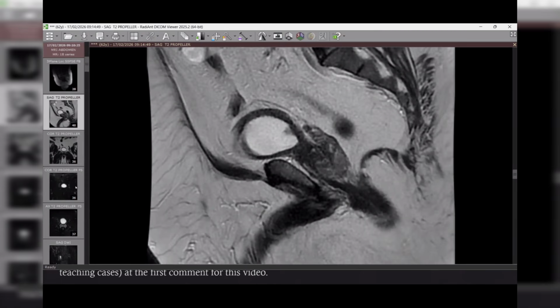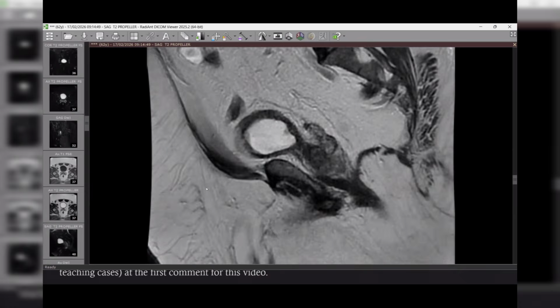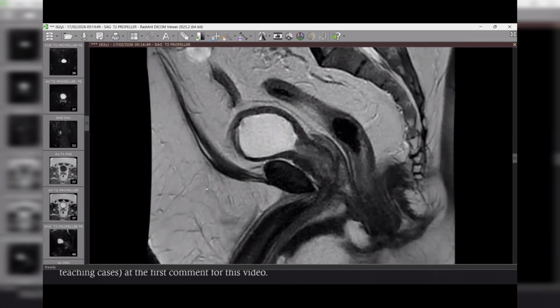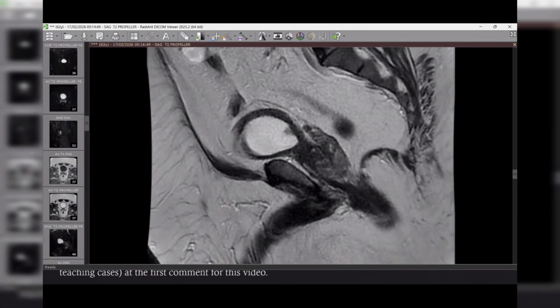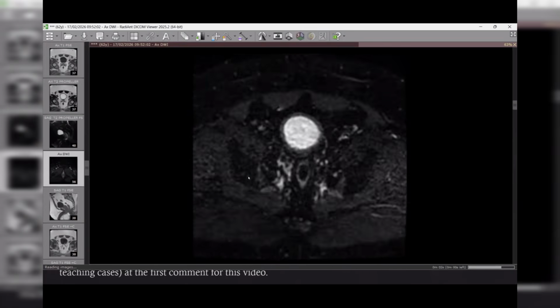So I'm thinking about an urachal lesion, likely an infected urachal cyst, but I cannot see any. I want to see the post-contrast images also, as well as the diffusion restricted images. Before the post-contrast, can I give you the diffusion? Maybe helpful for you.